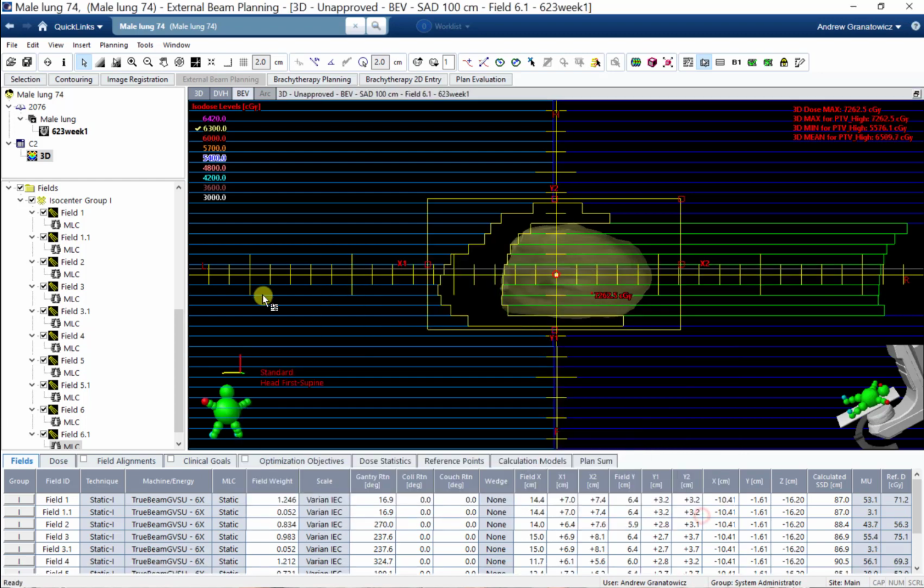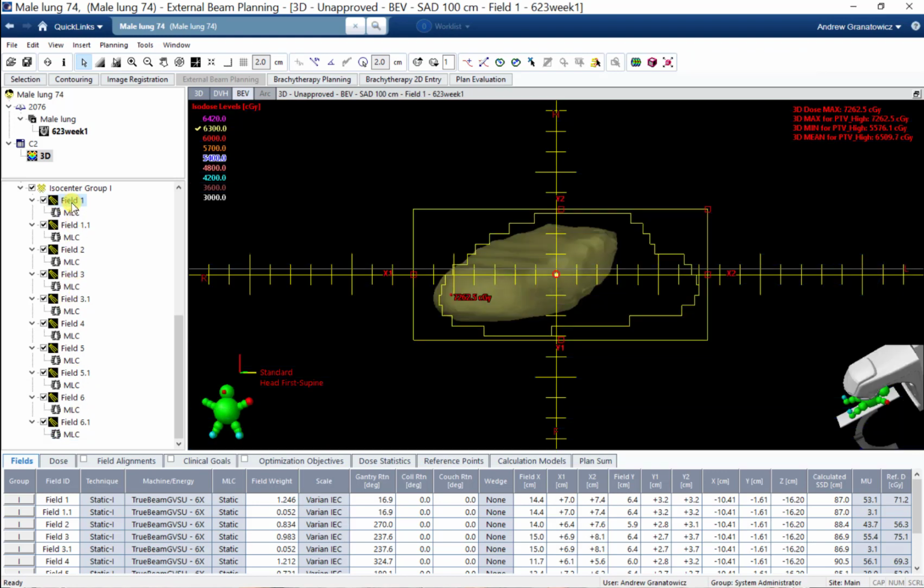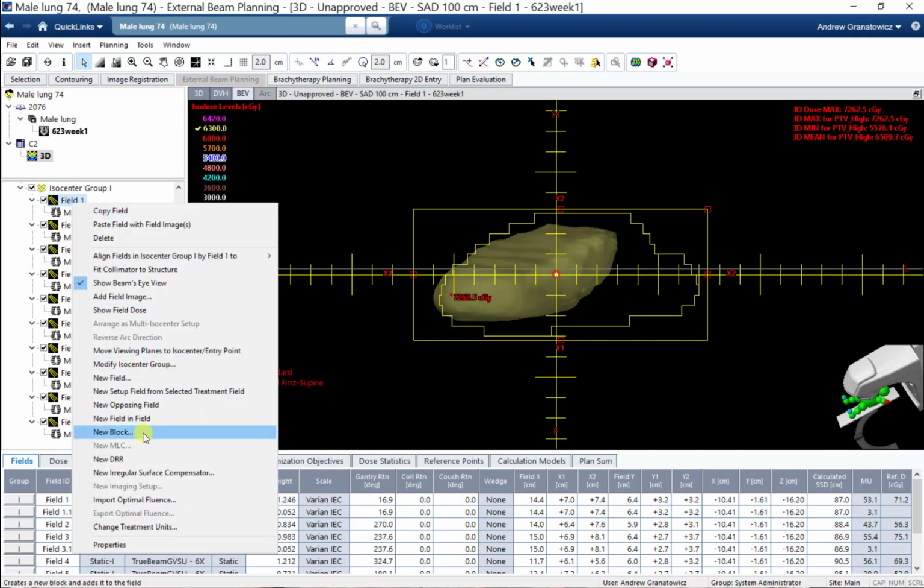Okay, so it is getting smaller. So I kind of have an idea of which fields to add the majority of our field and fields to. It's going to be field 1. That seems to make a positive impact. Field 5 and field 6. Field 3, I don't know, maybe later on in the process, but in the beginning, it's going to be mostly those 3 fields.